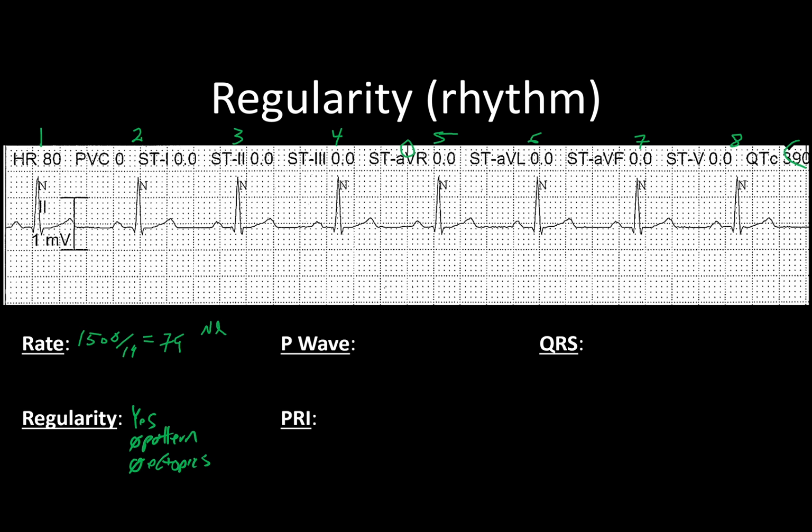Now, if I wanted to confirm that, of course, I would do what I did with rate, and I would mark out every single R to R, and I'd measure those, and do it on down the line to really prove it if I was ever curious. Using a set of calipers in real life is also really helpful, because then you can have them laid out in front of you and measure them out that way.